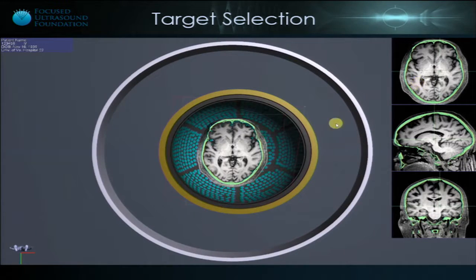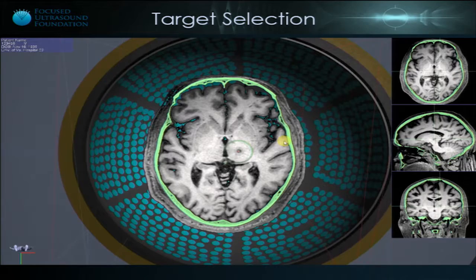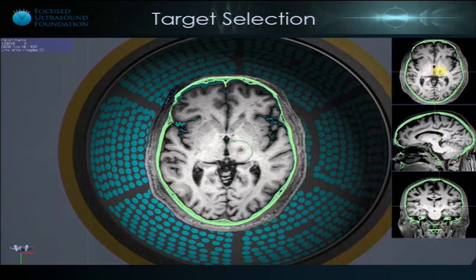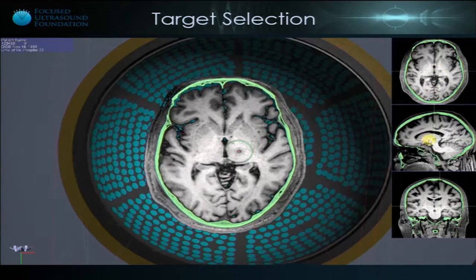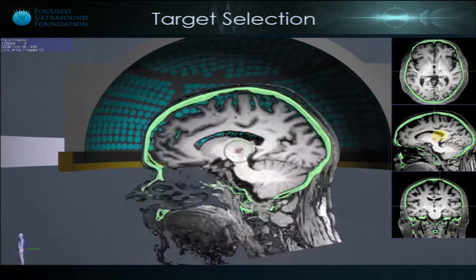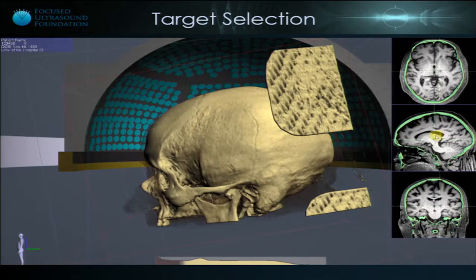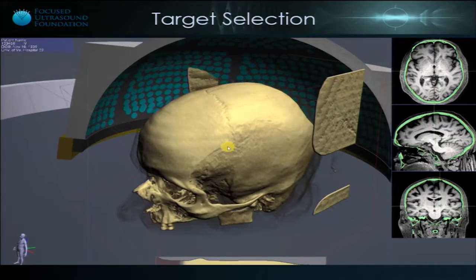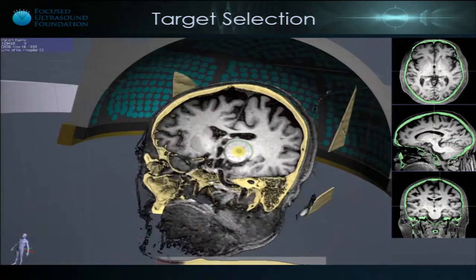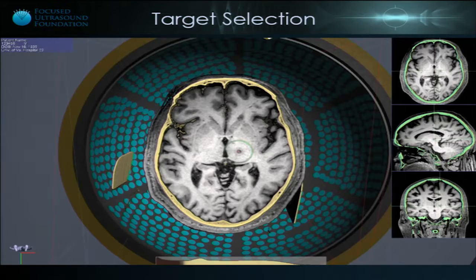It's a little hard to see probably on the projector, but the main view shows a slice through a registered 3D CT and MR data set. And over on the right in the MPR views, I'm picking a target, which then moves the focal spot of the transducer to where I'm pointing. Because this is 3D, I can resample this on any plane I wish, and it's always centered on the focal spot and showing a plane that's always normal to my viewing direction. And of course show it in 3D with some volume rendering. And again, I'll slice back down to the focal plane. Okay, so that's how we can pick particular places to put our focal spot in the context of this.